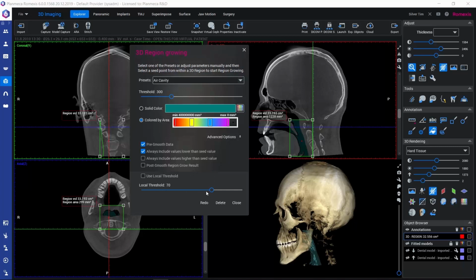So this threshold here would still refine the segmentation somewhere where the segmentation is finishing in those voxels. So it will still adjust which voxels will be included in the segmentation just around those voxels on the border. So if you wouldn't manage to include all the anatomy here in the segmentation that you would like to have there, maybe you could still try playing with this local threshold.